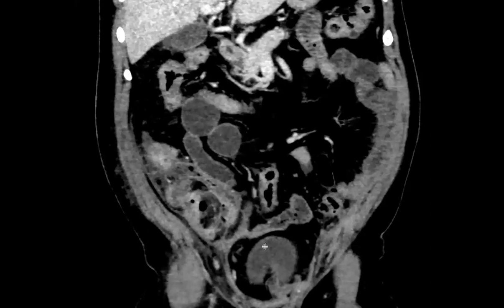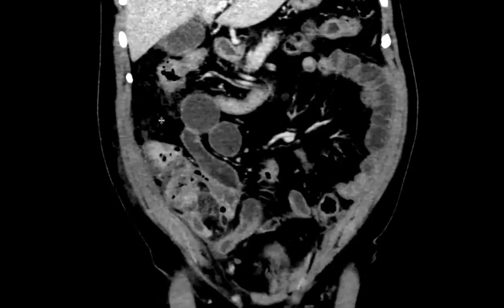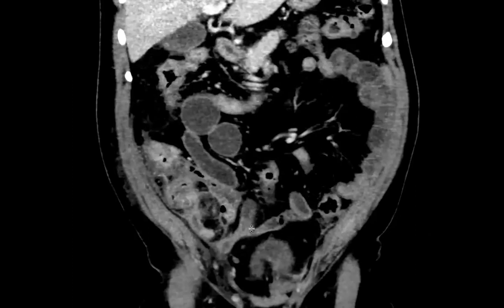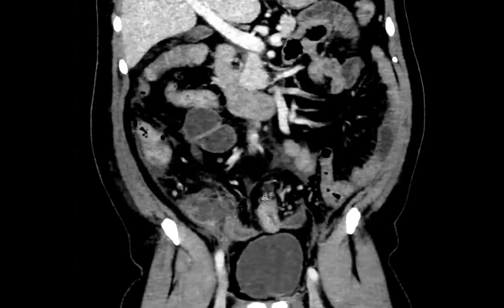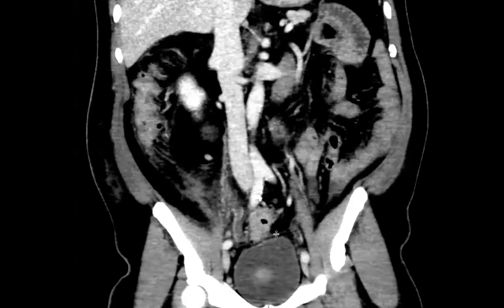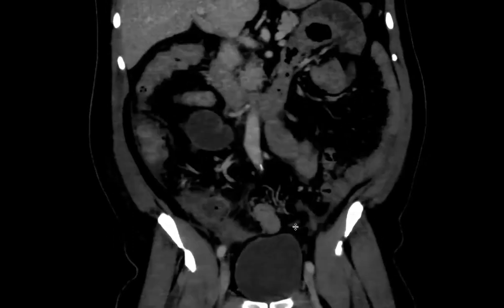I looked up literature. There are case reports where they talk about mets to the appendix from cecum or ascending colon. I didn't find such a distant colonic primary causing appendicular mets. So I just thought this case was very interesting. And again, as Aarti alluded to, satisfaction of search was not the case when they rightly found the sigmoid mass.